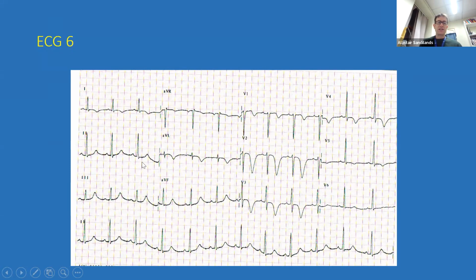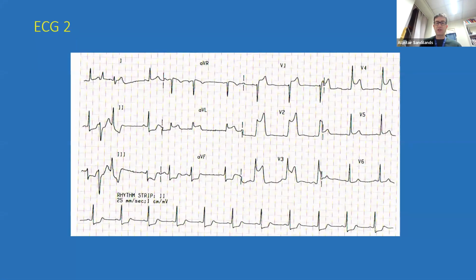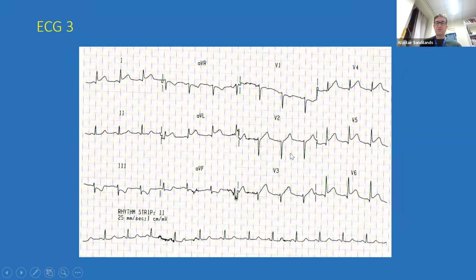Yeah, but what does that mean? The ST segment here is okay, and so really this is your main abnormality where the T wave is inverted. But I really do get what you're saying. I don't think they're hyperacute necessarily. And again, it's really difficult for you to see this and then see the other example where I said they were hyperacute. You see what I mean? So you think, well, there's not much difference really.